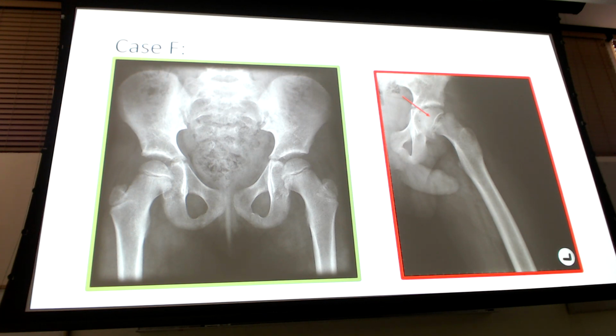It can be difficult, right? I've given you very extreme ones. I will agree with you that when you go to Radiopaedia, what you were saying, a lot of the skiffies are difficult to see on X-ray. Agreed. Because what's another name for a skiffy? Salter-Harris 1. When we talk about how subtle Salter-Harris 1s can be, right? But let's say you didn't see it on X-ray. If I give you this patient presentation, do you need it to suspect it? No, you do not. Right?